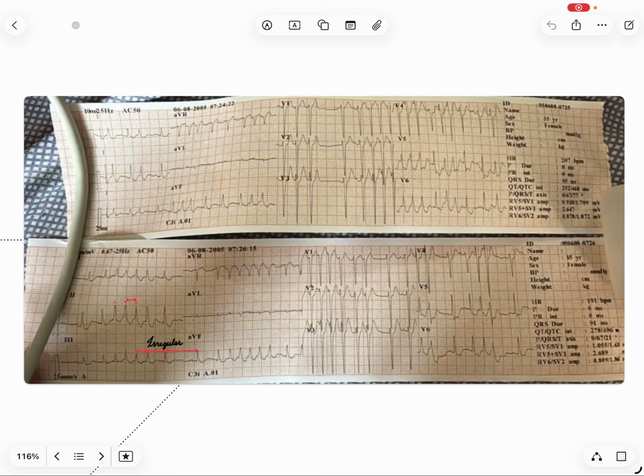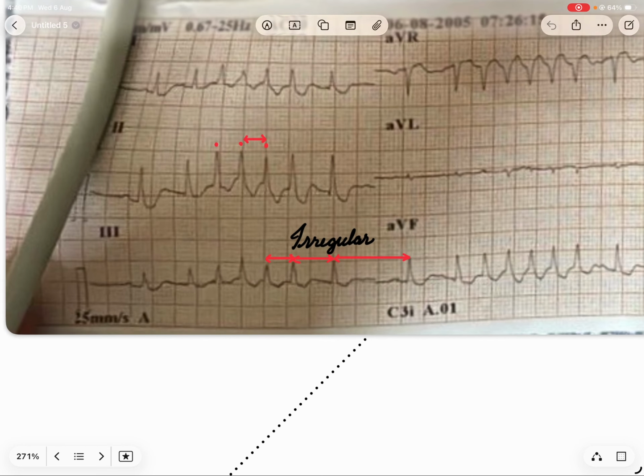So broadly, what we can see from the primary ECG is that there is some tachycardia, and when there is tachycardia you can see the rate is variable, but somewhere between 150 to 300, and comes around an average of 200, suppose. I hope you all know how to calculate the rate of an ECG. We can discuss that someday later. We can also see that it is irregular.